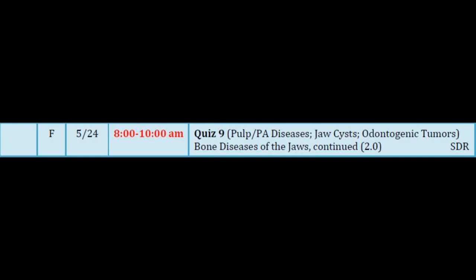But age can be very helpful in picking the best diagnosis. These are neoplasms, so they present as well-defined, usually 3-dimensionally round to oval lesions. They don't have a strong site predilection. This young girl is 10 years old. You can see she's got an expansile maxillary lesion.